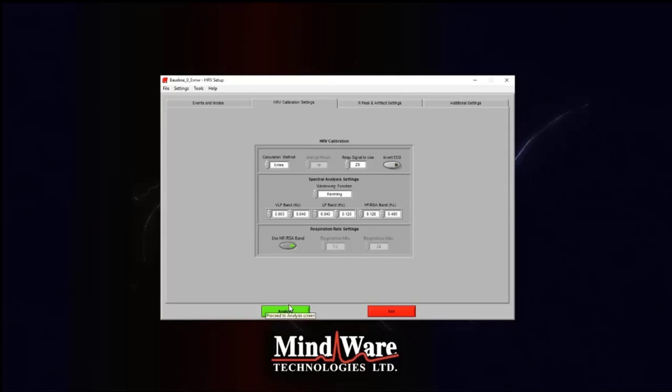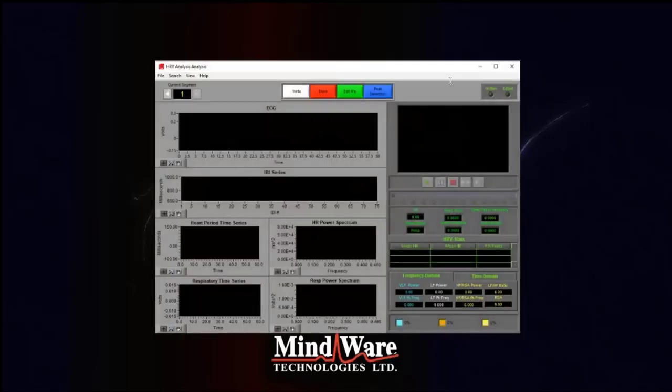Okay, so now is a really good time for me to go ahead and actually start editing the ECG data that we have for our baseline condition. And so I'm going to hit Analyze.